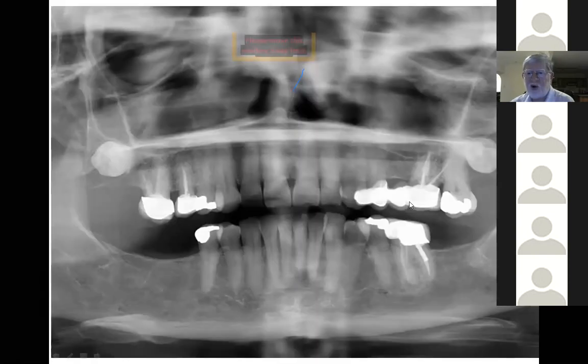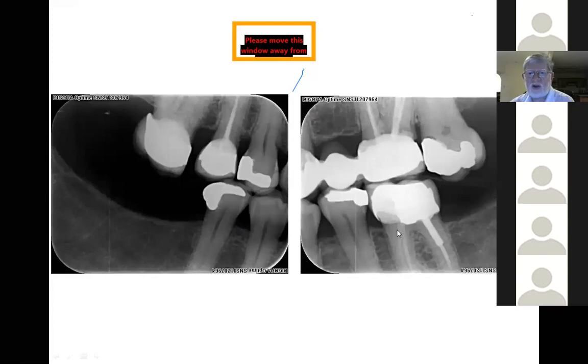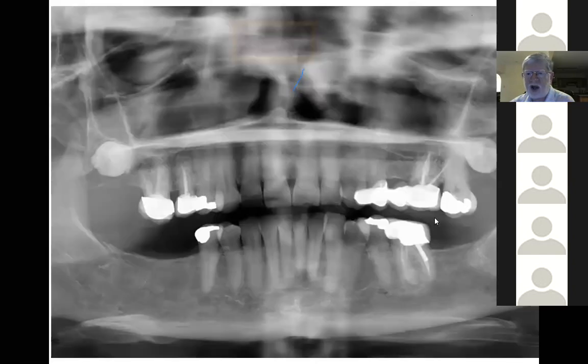Do we go for re-endo because you don't want to compromise the bridge? Or do you section this there, take that out, put an implant there, put an implant there? But certainly when you're seeing the patient for the first time, and that's the reason for the following radiographs, don't just leave things as this. This patient's had quite a lot of other work done, bigger work done. So follow up, make sure that there's nothing else that's going on.